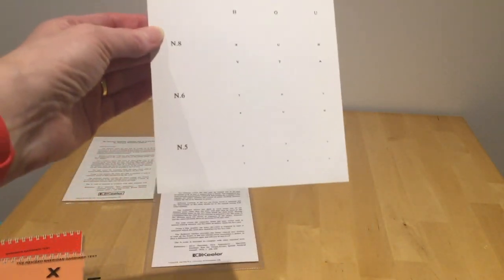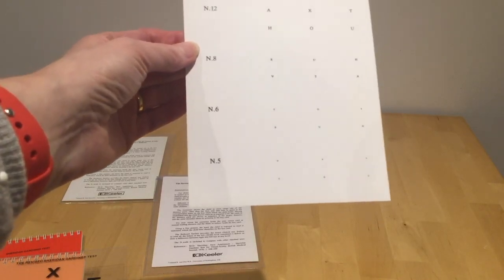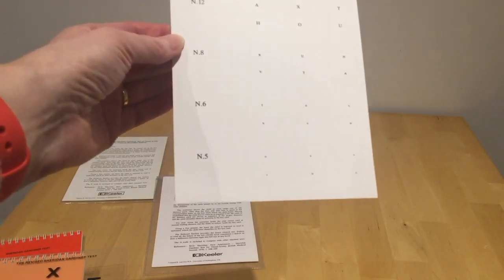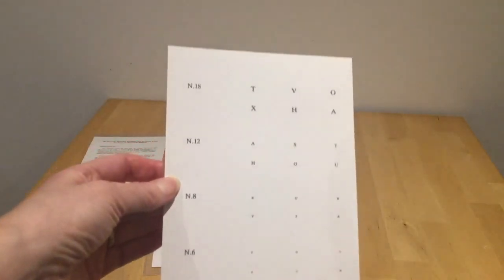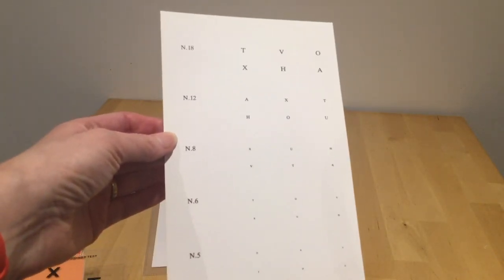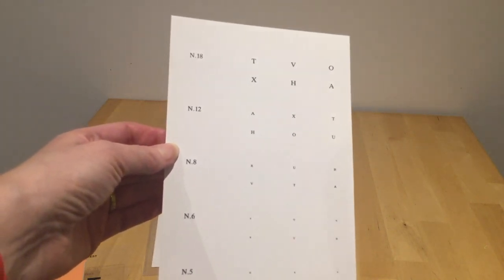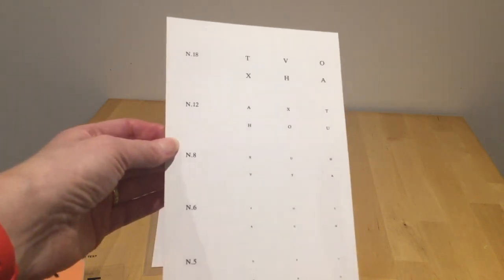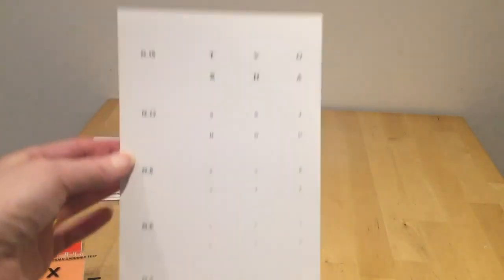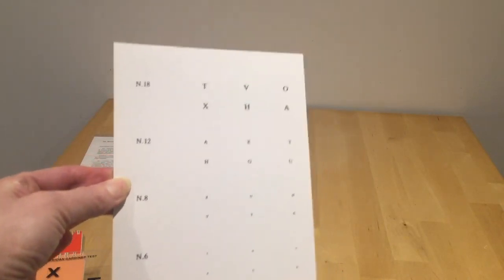The child could go as close as they wanted to see it, but it's quite limited in what it's assessing, because it doesn't have the full range you would get in McClure, for example, which is crowded as well. So I think it's fairly limited, but something to show you, just to make you aware that it exists.